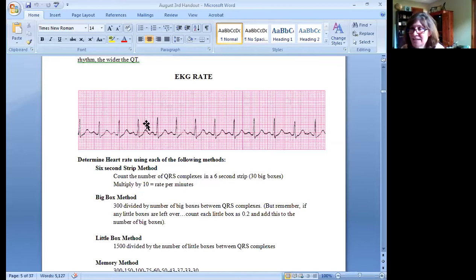This is sinus tach. And one thing you're going to learn about sinus tach is usually it's not a problem. It's usually just in response to something, like, oh man, their fever's back, or they've had vomiting and diarrhea for a couple of days. They're going to need some fluid. And it's all about that equation, written in your handout, and you already know it: cardiac output is equal to your heart rate times your stroke volume.